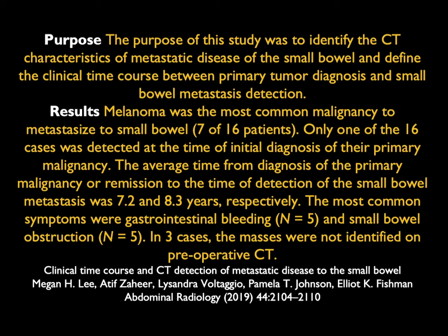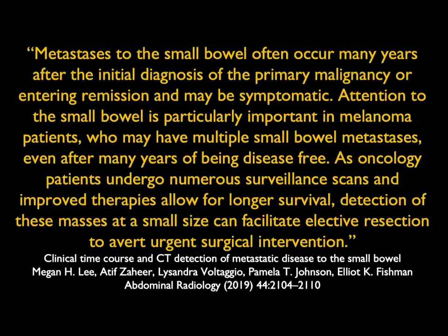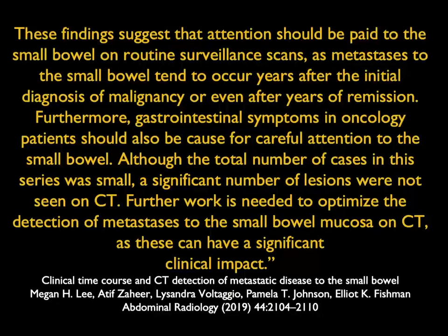The patient's primary tumor may be a distant memory, but it's something you need to look at. Metastases to small bowel often occur many years after the initial diagnosis. Attention is particularly important in melanoma patients. As oncology patients undergo numerous surveillance scans, you need to look at the bowel very carefully. And that becomes very, very important. Further work is needed to optimize the detection of Mets to the bowel mucosa on CT and their management.